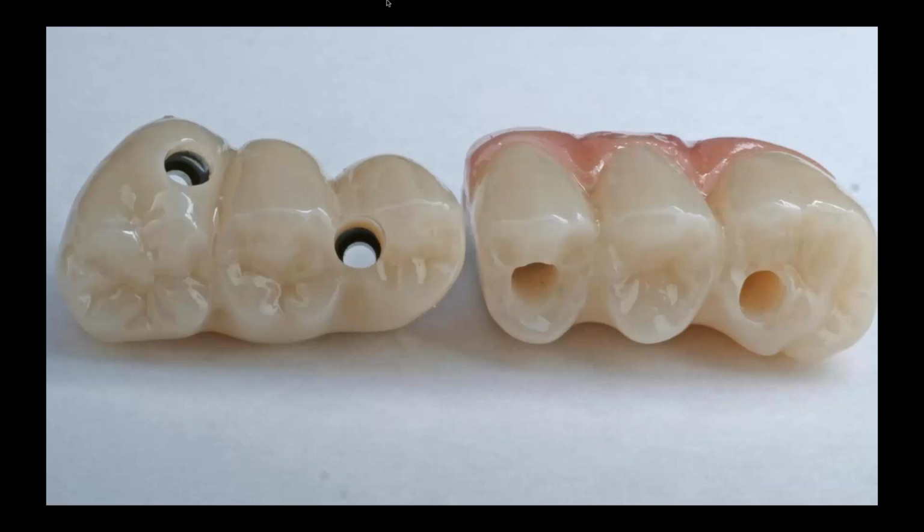And I think a lot of us who have a lot of experience doing freehand implants would argue that we would not end up with a result that we see on our screen left. However, would we necessarily end up with a result as good as what you see on the right? And the answer is maybe, maybe not. So how do we get to that result that we're seeing on the right-hand side? Let's talk about the entire workflow. And I'm going to talk about the software strategy and solution that we use to bring it all together.